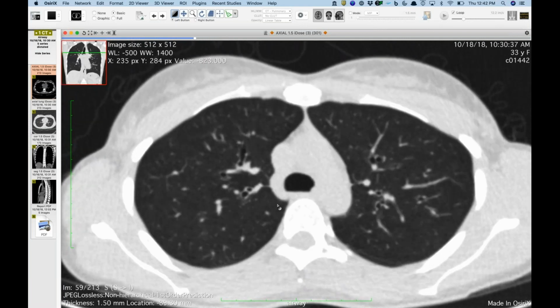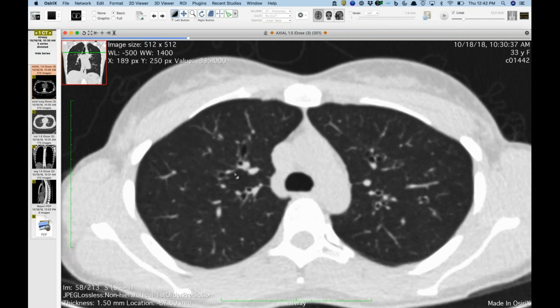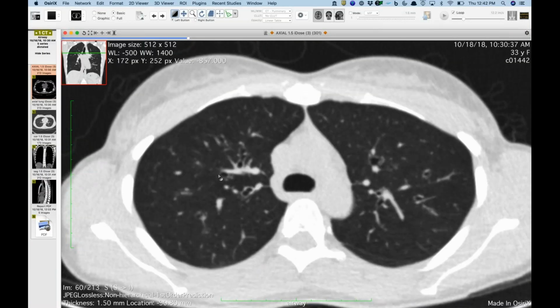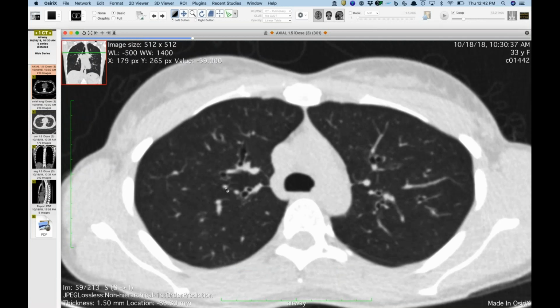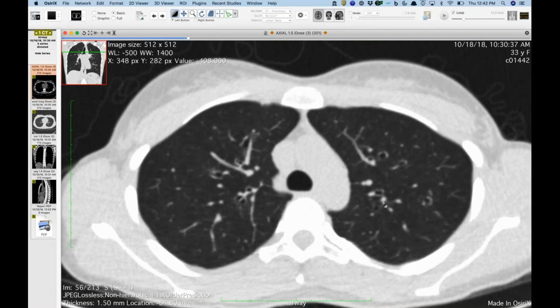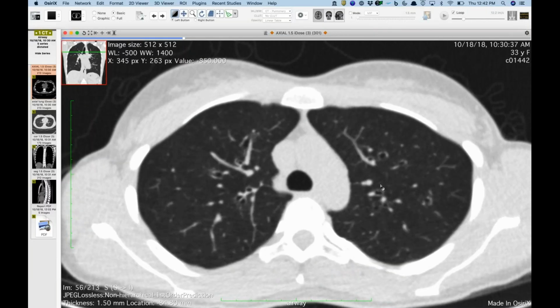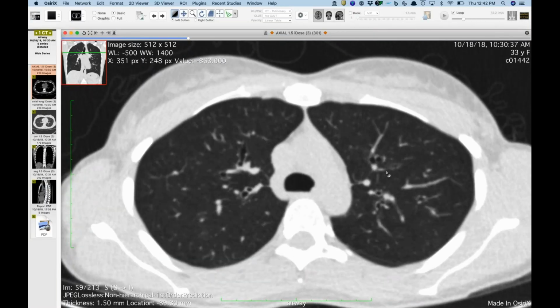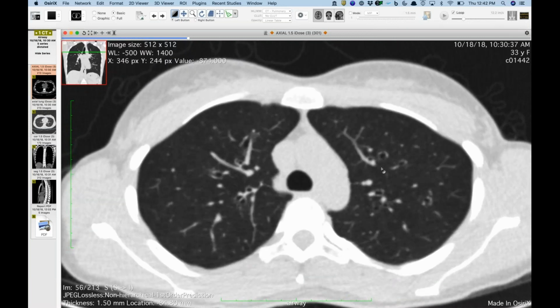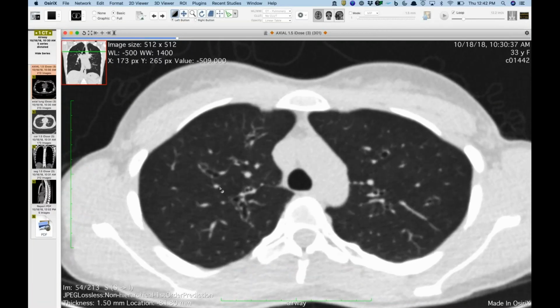I've heard of that being done for patients with asthma, and the idea is you use some sort of thermal injury to the airways from a bronchoscope to basically release the smooth muscle, so you get less smooth muscle contraction. But I'm just wondering if you guys have any other ideas, like could this be ABPA or could it be EGPA associated with the patient's asthma and not a result of the bronchial thermoplasty? Because it's just a really odd look.